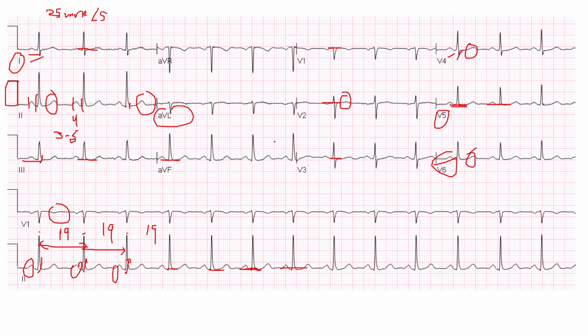the RR interval. For example, this one is, we said 19 small boxes, but let's take around 10, two large boxes, as the middle between two RR intervals, okay? The T wave comes before the middle of the RR interval. That's why the QT interval is normal. So this ECG is totally normal. Normal sinus rhythm with no abnormality.